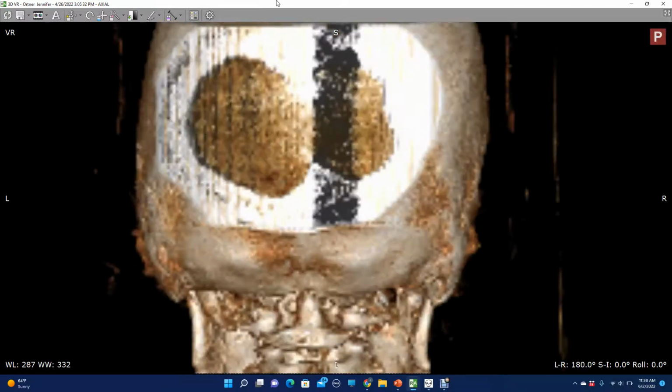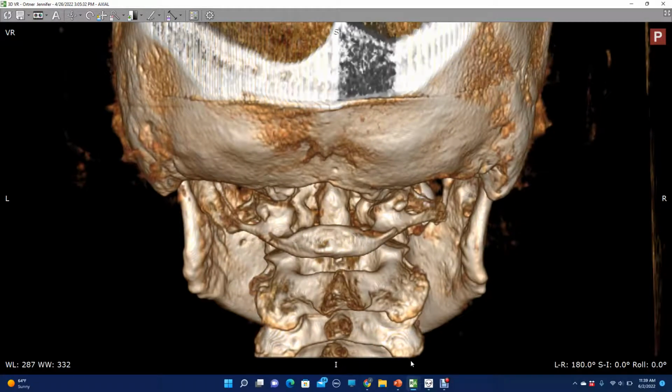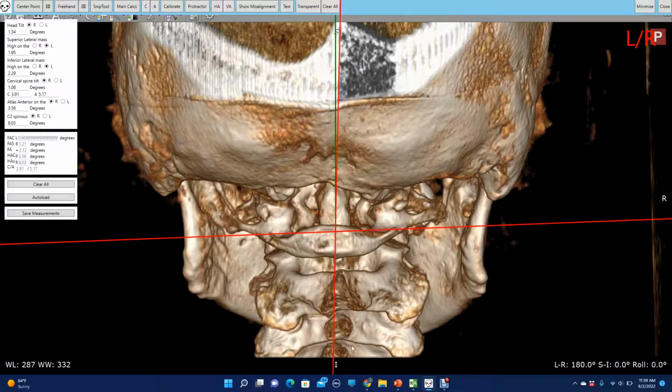I haven't checked that that's perfect, but close. And if we pop this open, we have show misalignment now. And her right is on this right. We'll drop this down to her plane line. We're going to take this guy and put it on that lowest spinous, and this will go through her head tilt.